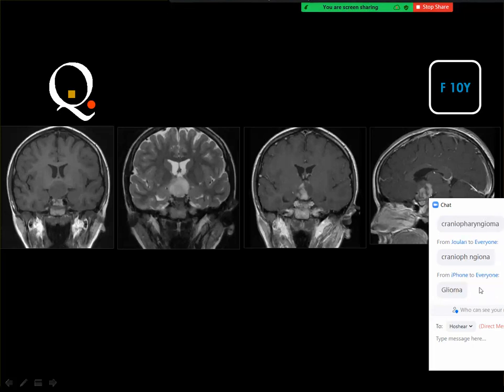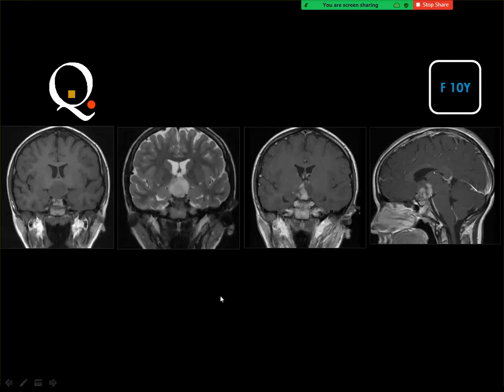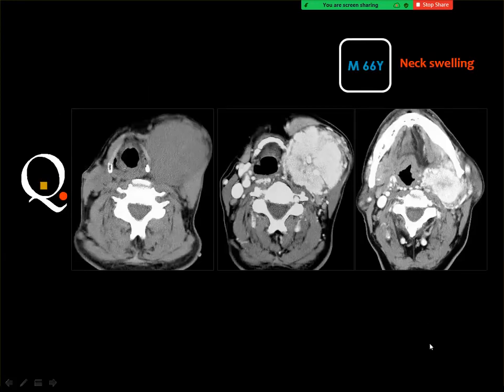This is a hypothalamic glioma. Yes, this is hypothalamic glioma. You have a solid lesion and there is no cystic component. Look at the CSF, and this is a solid component. And if you inject contrast material, this is not a cystic component because it shows enhancement, homogeneous or heterogeneous, in the sagittal image in the suprasellar area. In a child, you should think of hypothalamic glioma.